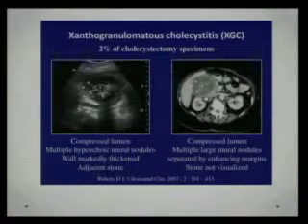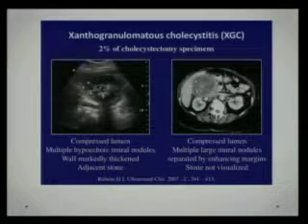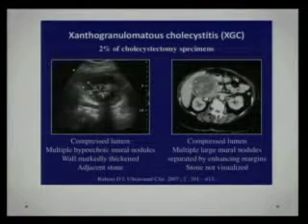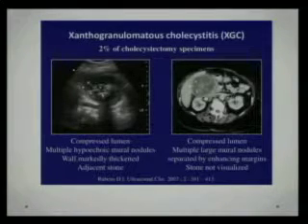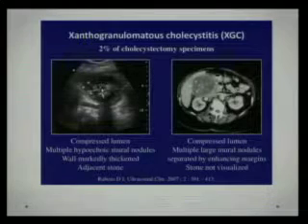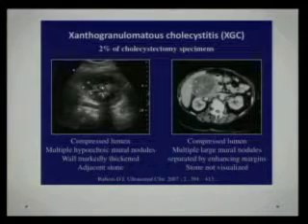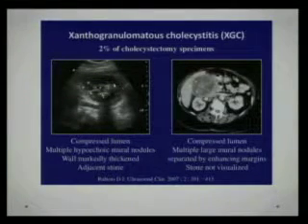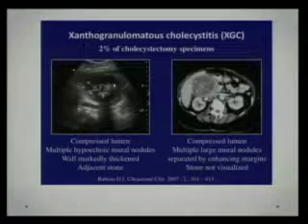Coming to Xanthogranulomatous cholecystitis, just remember only 2% of cholecystectomy specimens demonstrate this form of acute or chronic cholecystitis. What do we see? We usually see a compressed lumen. Compressed means these are not hugely distended gallbladders. There are multiple hypoechoic mural nodules. What we need to understand is that this star, or the asterisk, is the lumen. The structure from here all the way to here, all around in a radial fashion, is the mural thickening, or the wall of the gallbladder.